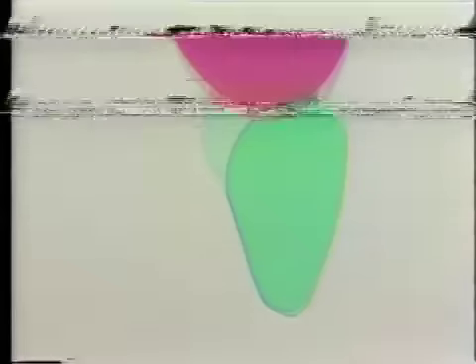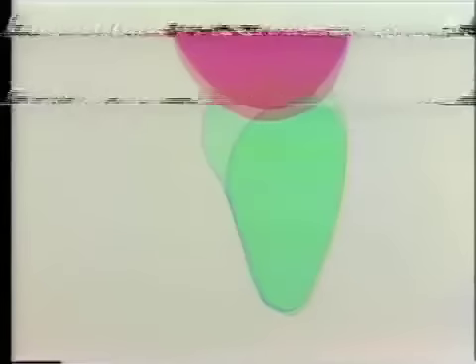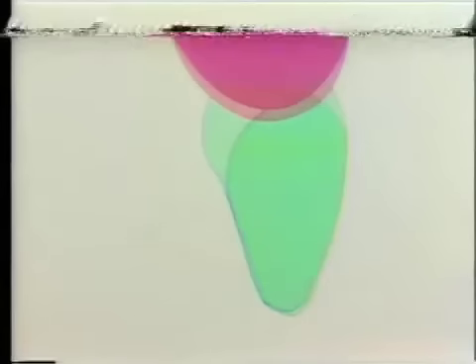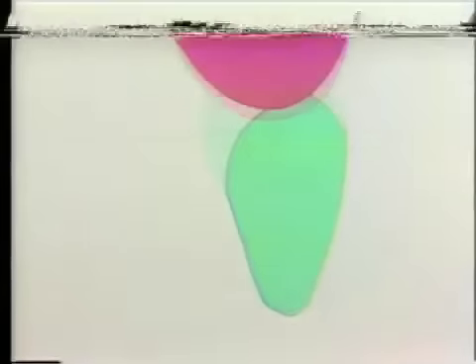And if we can superimpose the original natural tooth over this, I think you can see how the level there between the point of contact of the cervical of the natural tooth and that of the Pontic is at the same vertical level there. And our Pontic seen from the normal view would be of the same length as the original tooth there. This has been achieved by swinging in the labial surface of the Pontic in the cervical third there.